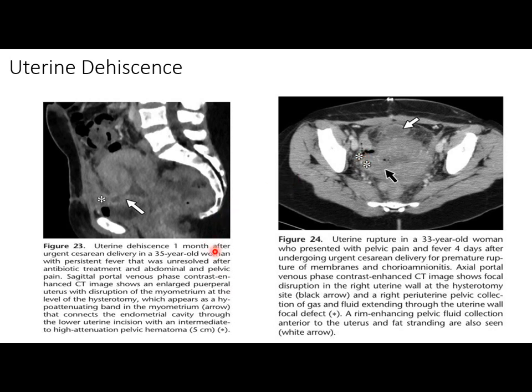There is a peripheral enhancing mass anterior to it. So you can see the serosa intact here. It's not communicating till here, and stops. While here it's from the endometrium to the peritoneum, complete communication. Open.